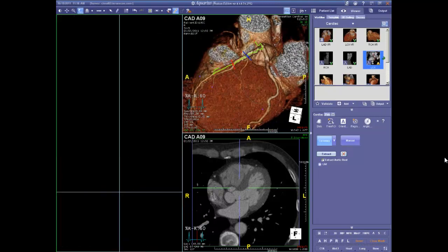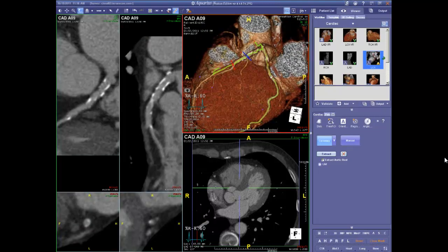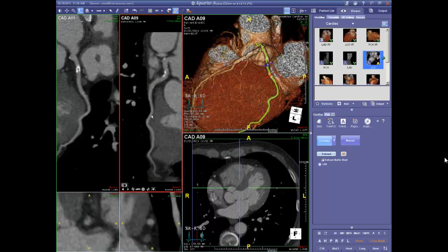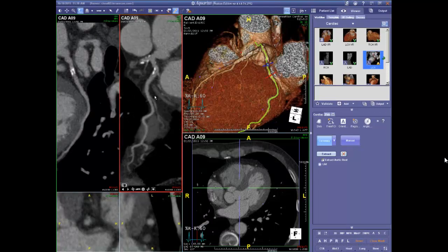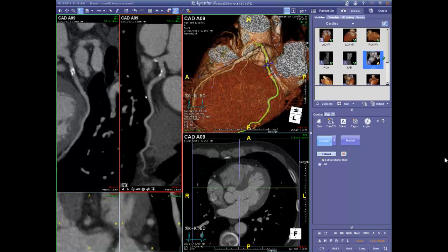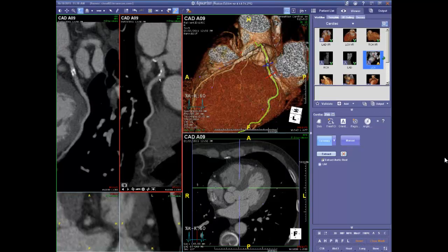circumflex, a large vessel, and single mouse clicks will typically bring that into view. And I'll go ahead and click on the vessel that I like. And with the same techniques, we can go ahead and find a rendering. Both of these vertical windows over here are multiplanar reformatted images that happen to just be stretched onto a single two-dimensional surface. And we're looking at two opposing 90-degree angles. And this particular technique is nice because we can pirouette around the vessel just by sweeping the mouse.